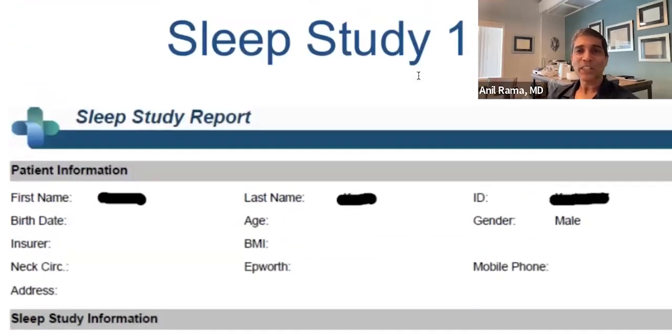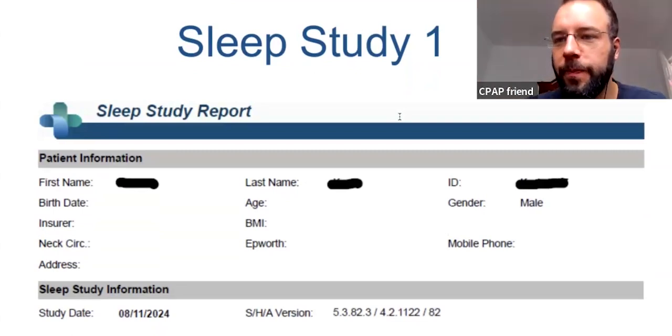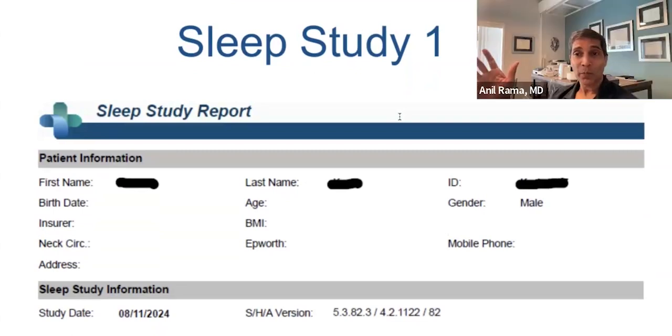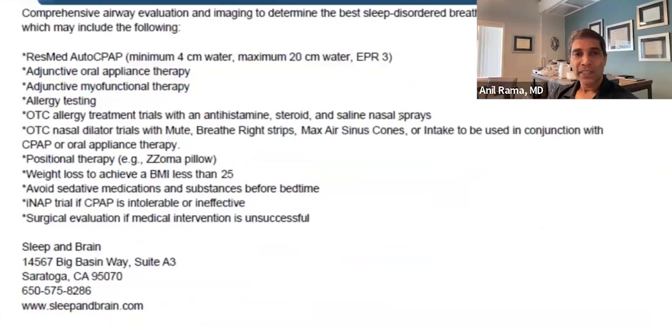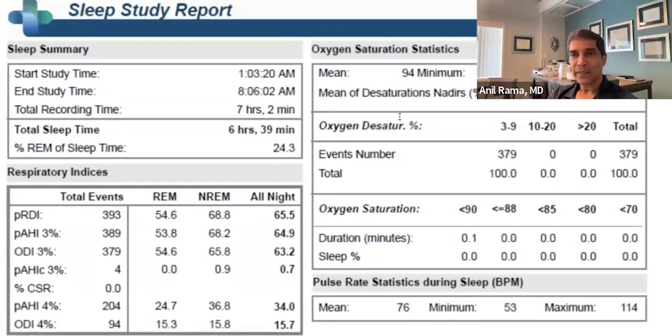Oh, okay, yeah. Andrew, like we said, I asked my team to assemble 10 random, not even random, 10 consecutive WatchPAT reports. And I haven't even seen this. I said, blot out the names, give me 10 in a row, good or bad, I don't even care. And we're going to go over on Andrew's podcast what these 10 are. So let's just go over the first one. And then you go over the recommendations. I'm going to leave that out for now, and I'm just going to go to the data.